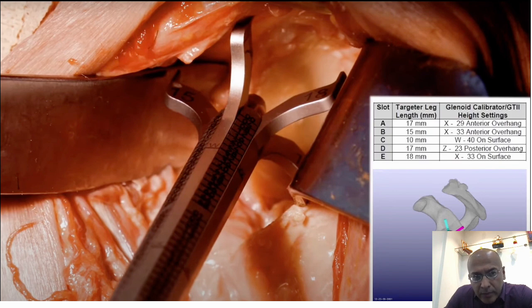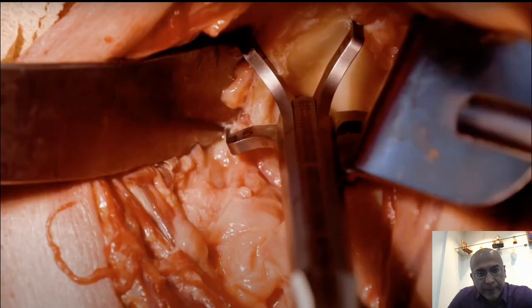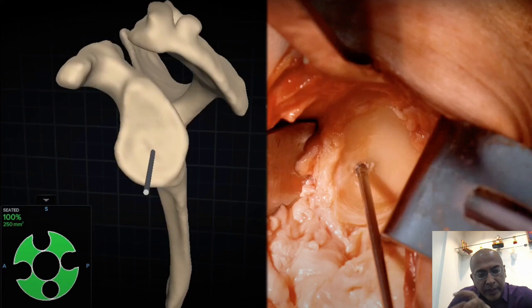This is all planning. So how do I actually do it on the shoulder? It's done like this. I have a specialized 5 spoke device called a jig, or a 5D jig, which I can place on the glenoid, or the socket, and that gives me the correct positioning. With this device, you actually decide how this is going to be on the actual shoulder.